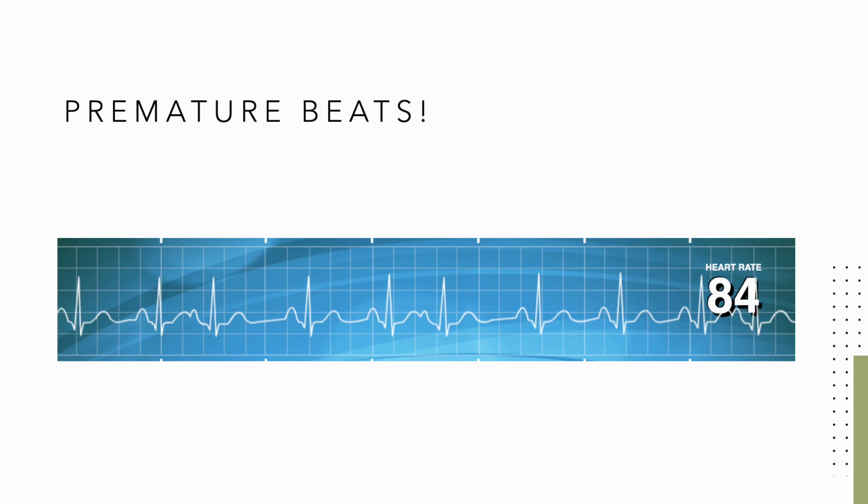The next thing I want to talk about is called premature beats, or extrasystoles, or aberrancy. The first premature beat is something called a premature atrial contraction. In the next three cases, I'm going to discuss isolated extra beats. There are times where these beats can become regular in things like bigeminy or trigeminy. However, we're only going to discuss these three morphologies.